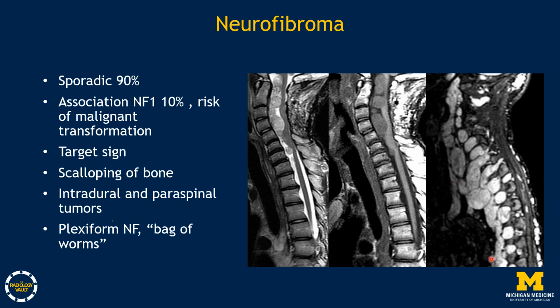The plexiform variant is distinct for its bag of worms appearance. In contrast to schwannomas, neurofibromas are often unencapsulated and fusiform and involve the nerve itself.